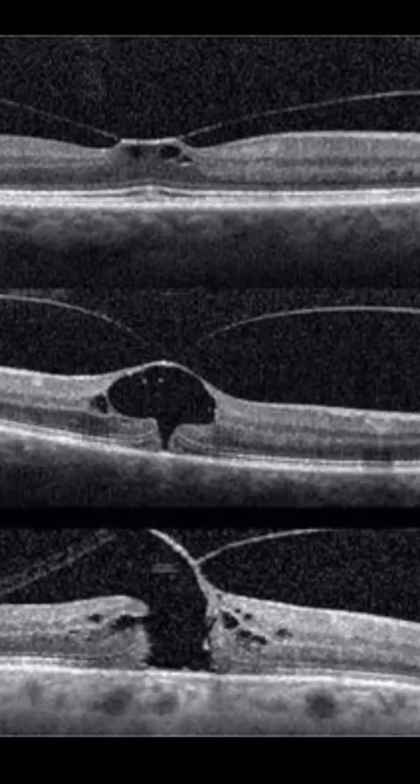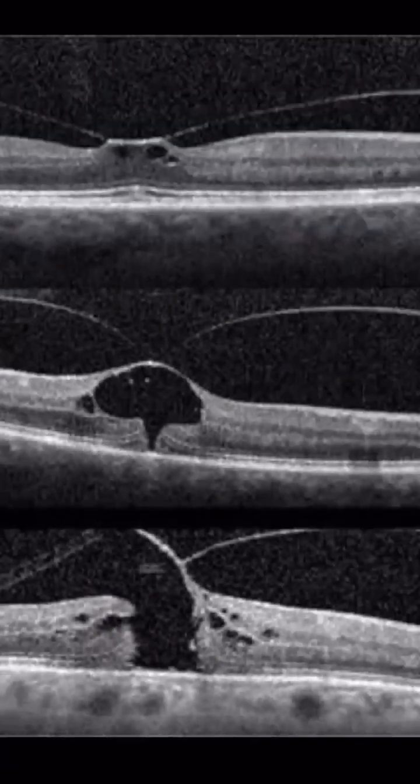Now, if you go on the last scan, well, the last scan has a large area of missing photoreceptors layer. You can see the ISOS goes here, it goes up, it's lifted, and then there is no photoreceptors centrally. This patient probably doesn't have great visual acuity, okay? Now let's see the next scan.